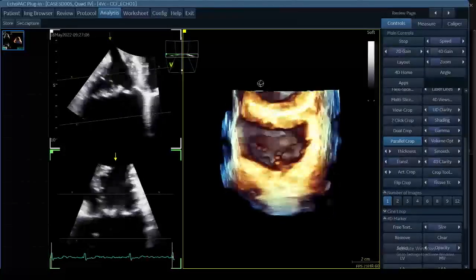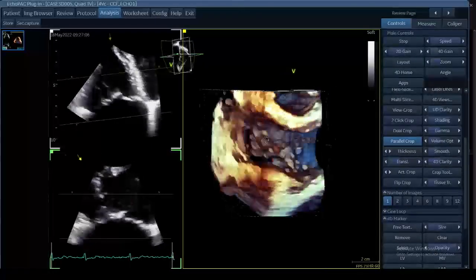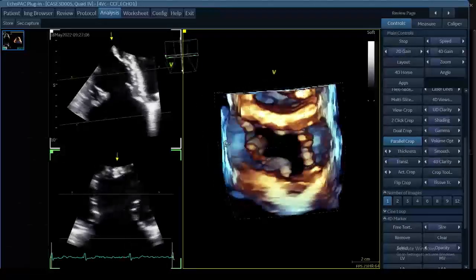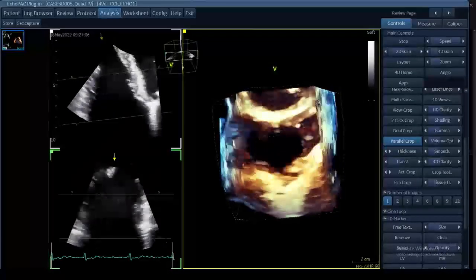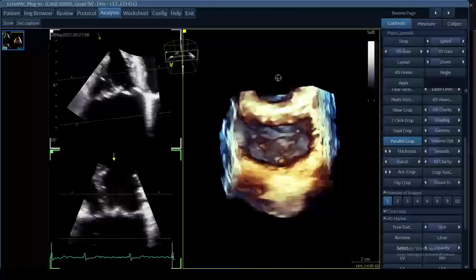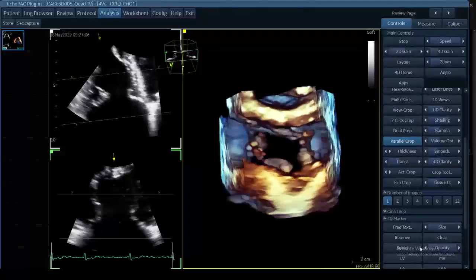You can see this is the ventricular septum. And so this is the mitral valve up top. And if you wanted to confirm that, you could actually kind of roll around. We can see that's some aortic valve right there. We could roll back around this way and just make sure that we understand where we are. So if our mitral valve is at the top of the screen, from a ventricular view, typically the mitral valve will be on the right and the tricuspid valve will be on the left. That would be kind of a standard tricuspid ventricular view.